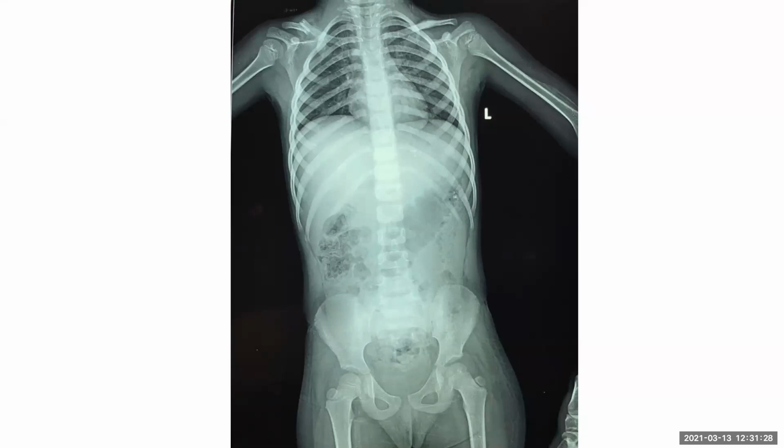I'm looking in a systematic way for other bones, any metaphyseal corner fractures or posterior rib fractures. I don't appreciate any other rib fractures, or any other metaphyseal corner fractures along the usual bones.